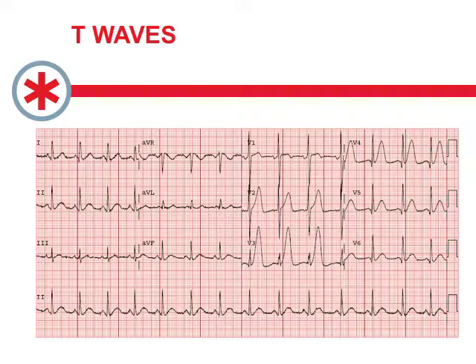So just take a moment and have a peek at this ECG. And in particular, I think your eyes are going to get drawn to the T waves, particularly V2, V3, V4. These are really what we call the hyperacute T waves we see in ischemia. They're big, and for sure when I see T waves that are larger than the QRS complex, I'm certainly going to be wondering what's going on. And in the right patient population, this would be worrisome for ischemia. So this is the chest pain patient or the patient with diabetes and shortness of breath, where they may not have a chest pain but a chest pain equivalent.